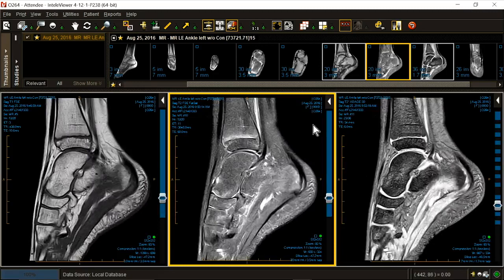If you have a growth plate injury, admittedly, it can be challenging to decide how thick is too thick. The metaphyseal side of the growth plate is always going to be a little shinier than the other side, because this is the side where the cartilage cells stack up to make the bone grow. So this is where the proliferative zone is. That's normal.